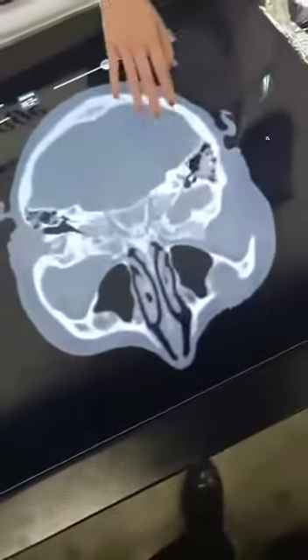And what's most interesting to me is you can load in your own patient CT or MRI scans, and from there you can get a 3D model of what you're seeing. So here we have a post-operative scan of a patient with a brain aneurysm, and this is the actual CT that was provided. You can go ahead and slide through the CT and see exactly where the clips were placed as well. So if I go down here, it'll show where it is here.